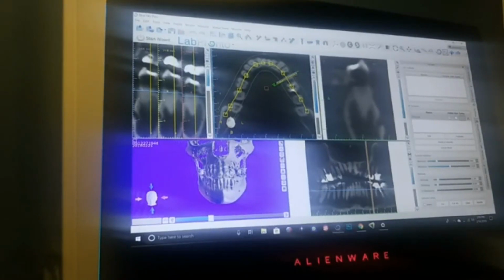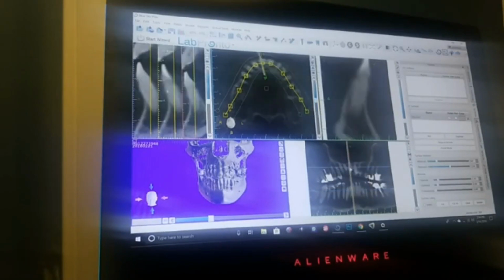And now let's say we want to switch. Now this patient, you put in a couple of implants in the mandible. You're done with your treatment planning, and now you want to look at your maxilla. I told you, don't be scared to click on what you want. In order for me to move the entire images, cross-sectional, axial, tangential, panoramic, into the maxilla, all I have to do is go into an image anywhere in the maxilla and click on it. So I'm going to go to the central incisor here in the panoramic view. I'm going to click. Once I do that, everything switches to the top.